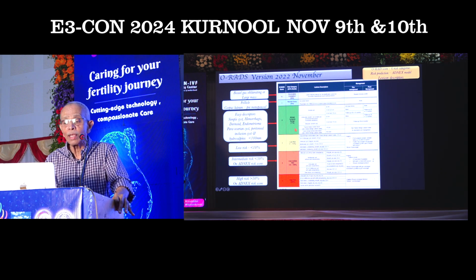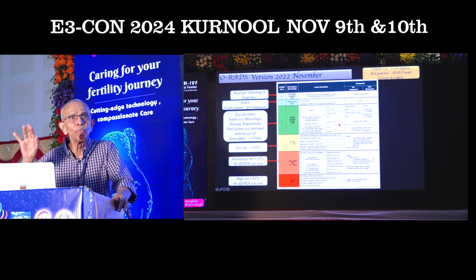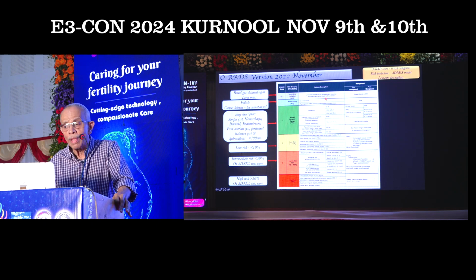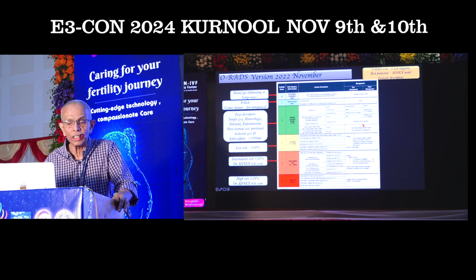So here we have a risk of malignancy, based on the O-RADS ADNEX model, of less than 1%. So positively it is a benign lesion. These are all the descriptors, that is the easy descriptors, simple rules, as well as the lexicon descriptors, which I have already discussed with you. So making use of them, you may need to categorize. I'll tell you the management strategies also in this.